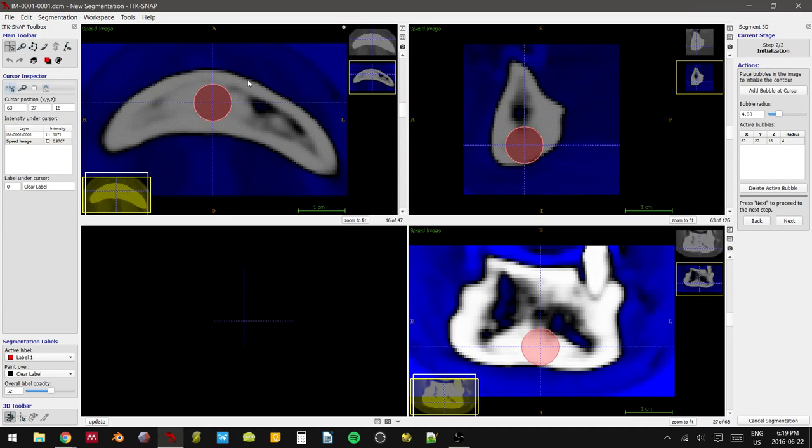The reason why you won't want to make your region of interest so big is that sometimes you're going to get two regions that are very similar in contrast. So for instance, teeth of the upper maxilla versus teeth of the lower mandible. And if we're only interested in either the maxilla or the mandible, if we have regions that are very close to each other in contrast, like those teeth, these bubbles will just fill both upper and lower parts of those teeth in, creating one solid model.